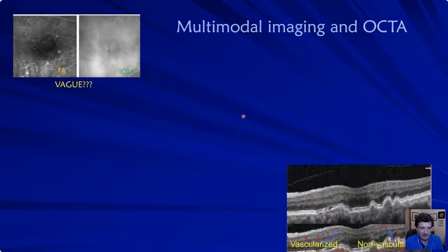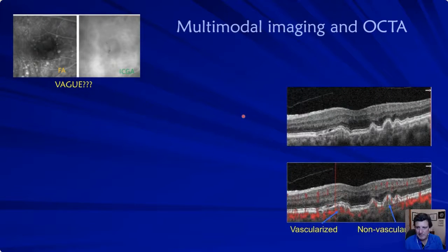I'll show you how I ended up with the fluorescein, because we sent this over to the retinologist, and it's kind of a higher level of interpretation. But I'm going to go through it here because you have to look at a lot of scans. You're just not going to pick it up on a single one. You have to scan through, move it around in this cube data. But as you scan through here, yes, you should have some nice blood flow in the choriocapillaris.